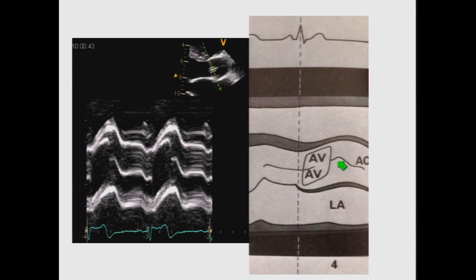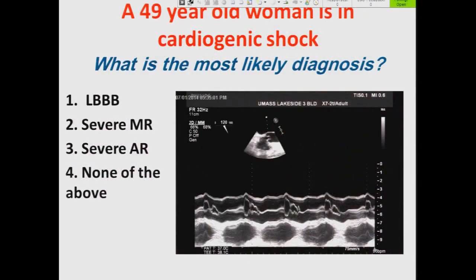And again, Dr. Kronzen showed you an example, and this would be prime board-type material, is they'll show you a case like he showed you where there is asymmetric closure. You see how this closure line in diastole is pretty much in the middle of the aorta. If you see this closure line in a very asymmetric position, that is a clue that you're dealing with a bicuspid aortic valve. In addition, one might see a dilated aortic root, which would be characteristic of bicuspid valves as well.